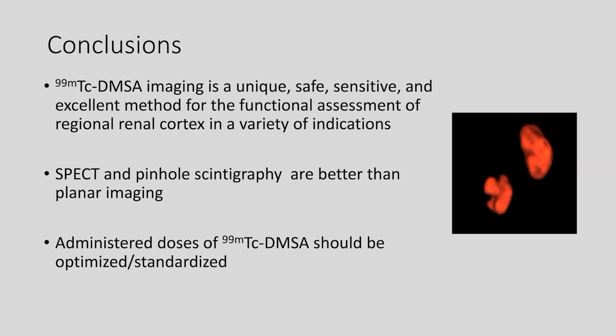We don't see the anatomy of the kidneys per se. We see the image of the distribution of a radiotracer in the renal cortex. It's very sensitive and I highly recommend that you use SPECT all the time.